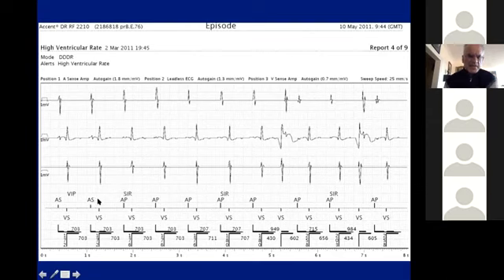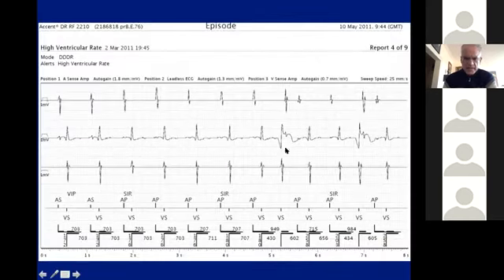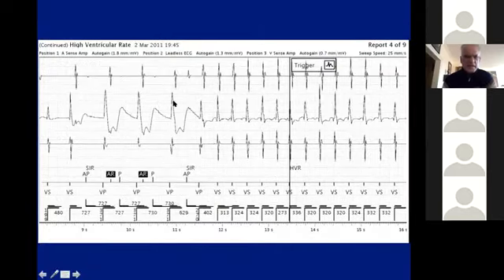What is VIP? Ventricular intrinsic preference. So this is the feature that promotes intrinsic conduction. So it was working here, but then when A pace takes over, it continues to do that. So VIP is present and SIR is present. Let's go back for a second. So here you have a PVC, bunch of PVCs, and then this is continuation of the same episode, and then something interesting happens here.